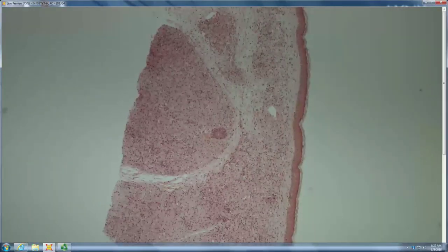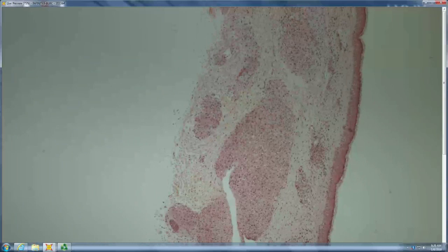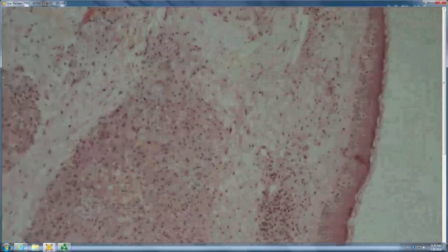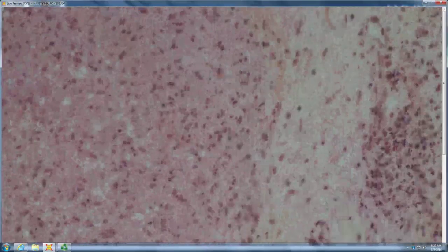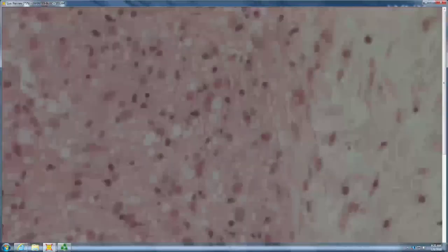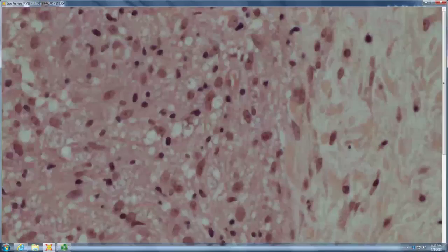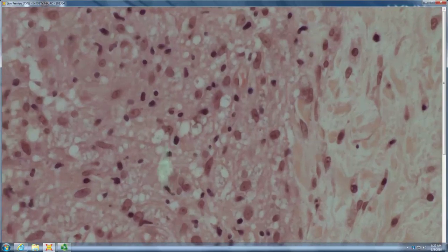Okay, so dermal infiltrate, and how would you characterize it? Granulomatous. So granulomas are histiocytes packed together with no intervening connective tissue, kind of horizontally oriented. Leprosy. And this also has lots of circles, and you look, is there stuff in the circles? If there's stuff in the circles, you want to stain it because there's globi, and this is leprosy.